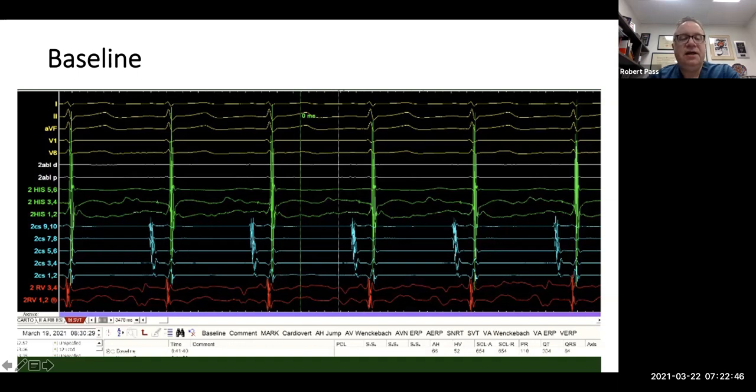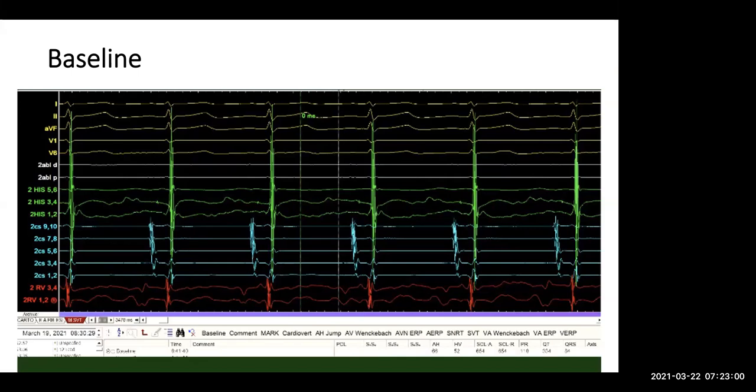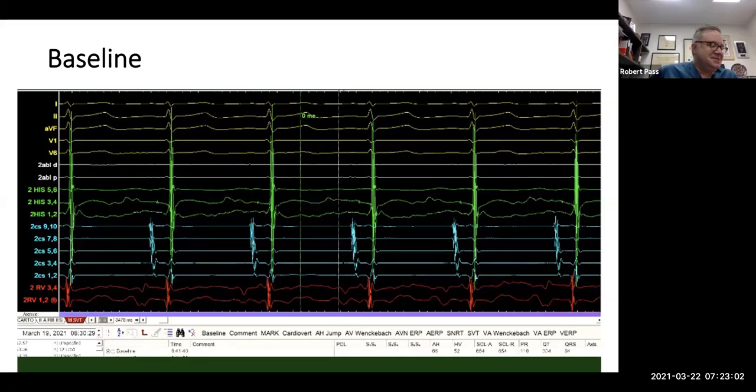So now that we have gone through that, Dr. Mohan says the patient is not pre-excited. Do you agree with that statement? I should mention he's a good electrophysiologist. All right, so I will agree. Okay. How do we know that though? How do we agree? Sean is right, but tell me why he's right.